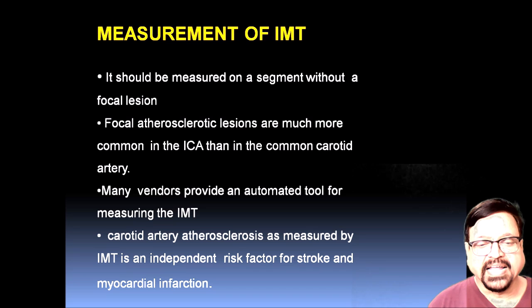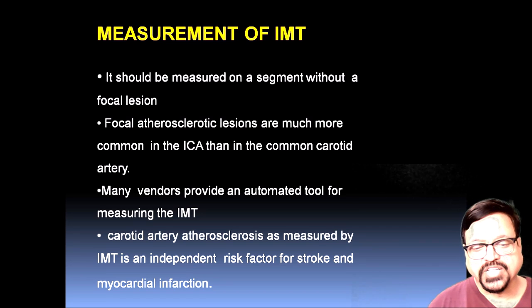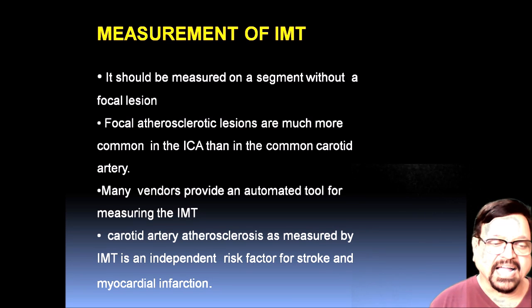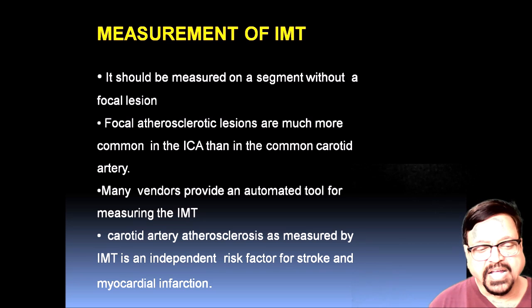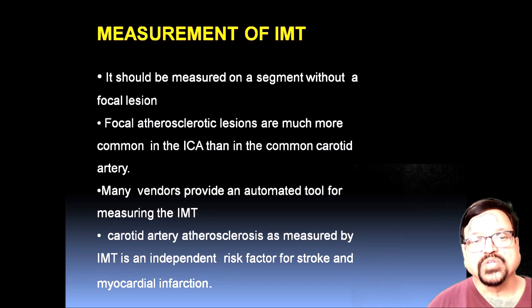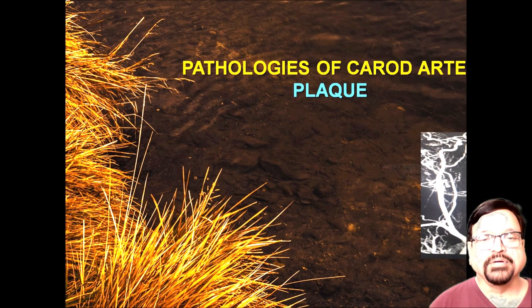Many vendors provide an automated tool for measurement of IMT. Carotid artery atherosclerosis, as measured by the IMT, is an important risk factor for stroke and myocardial infarction. So in these patients, they need it. Now let us go to the individual pathologies.